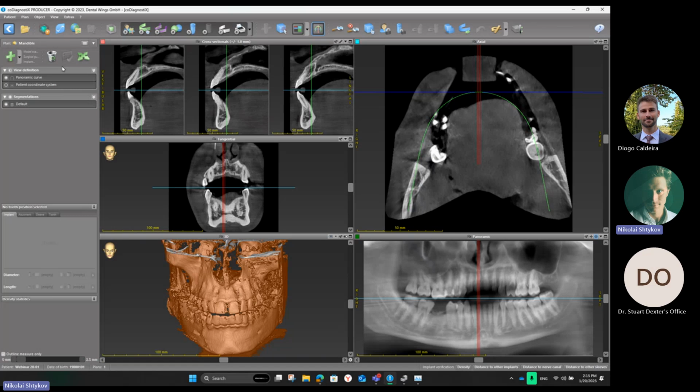And what's next? The next step, you also have here 1, 2, 3, 4, 5, and so on. These are our general steps. You can mix them. It doesn't matter to follow the numbers. But when you use the AI assistant, in the manual way you go through 1, 2, 3, but with the AI assistant, you don't need to do these steps. You actually jump to step number 4. Now you can see that here is a check mark, so the AI assistant finished this work. But I didn't open this yet because I want to open step number 4, and this is add model scan.